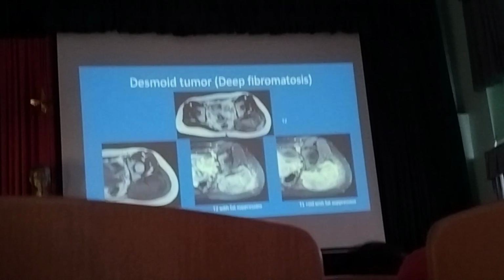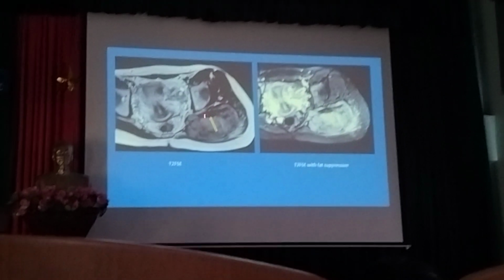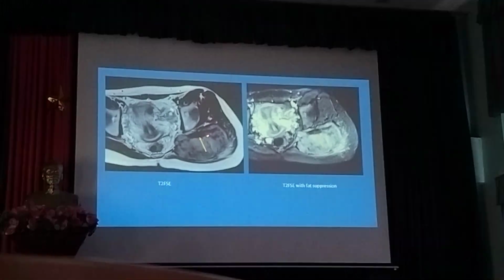Okay. So this is a dark signal that represents fibrous tissue.